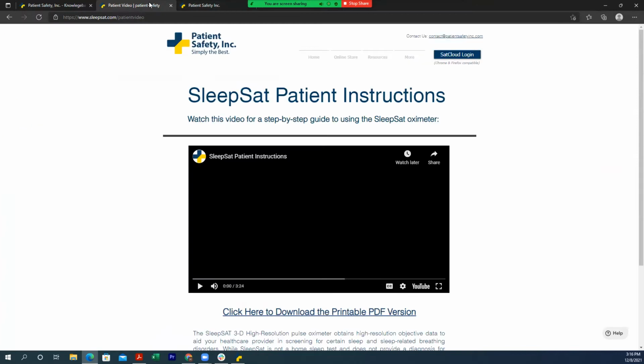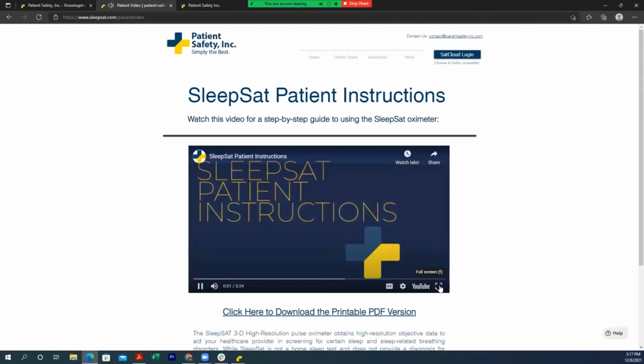I would like to go over the patient video. I'm actually going to increase the speed of this. We do recommend having your patient watch this patient instructional video with you in the office. We recommend having them watch it and then demonstrate it back to you. That quick learn and then demonstrate really increases the success rate with patients, because anything that they could be doing wrong, you have the ability to correct right then and there. So again, please note, this is being watched quite a bit faster than you will with your patient, but it can be a great tool for you.